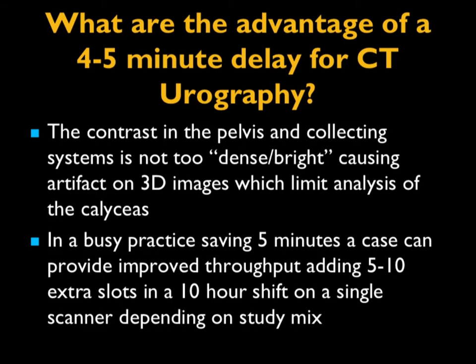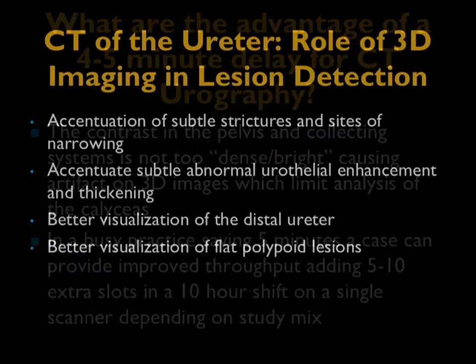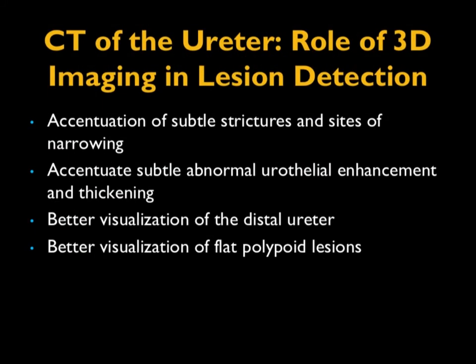Again, it's efficient, but as I'll show in cases, if the ureter is not opacified, it could take hours to opacify. But an unopacified dilated ureter is like an unopacified dilated small bowel loop. And I can easily, with reconstructions, be certain as to the transition point and usually invariably be certain as to its cause. Now with 3D imaging, it really can give a big advantage to this.